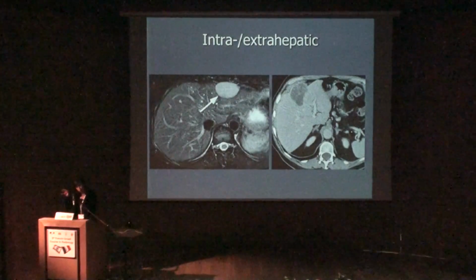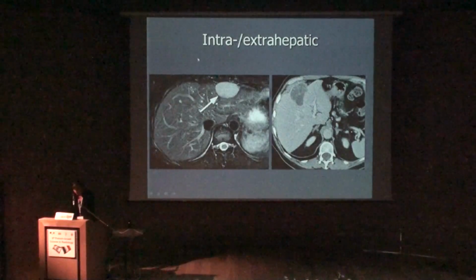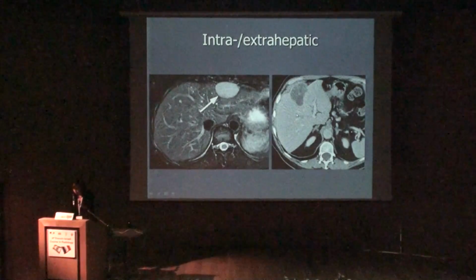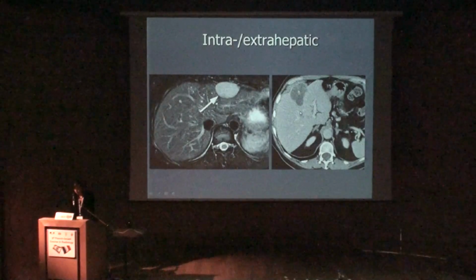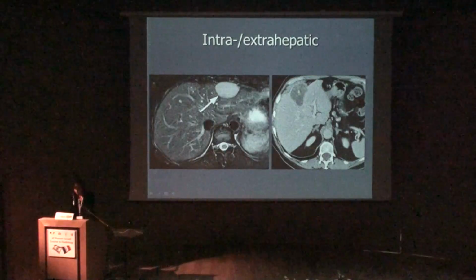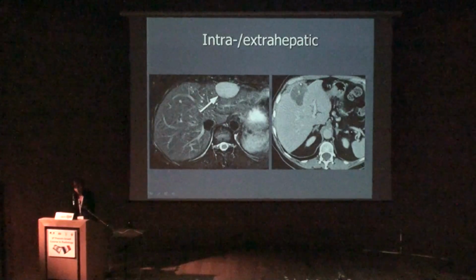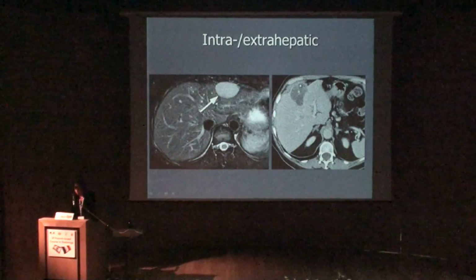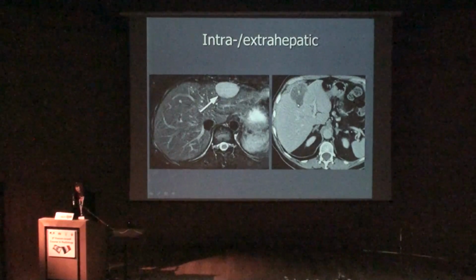Another example, in small lesions, we have here two examples, this one and that one. So if we try to assess where is the center of the lesion here, you can see that it's really at the border. So I would not say that this lesion is intrahepatic. It resembles a lesion extrahepatic that goes within the liver. Okay.